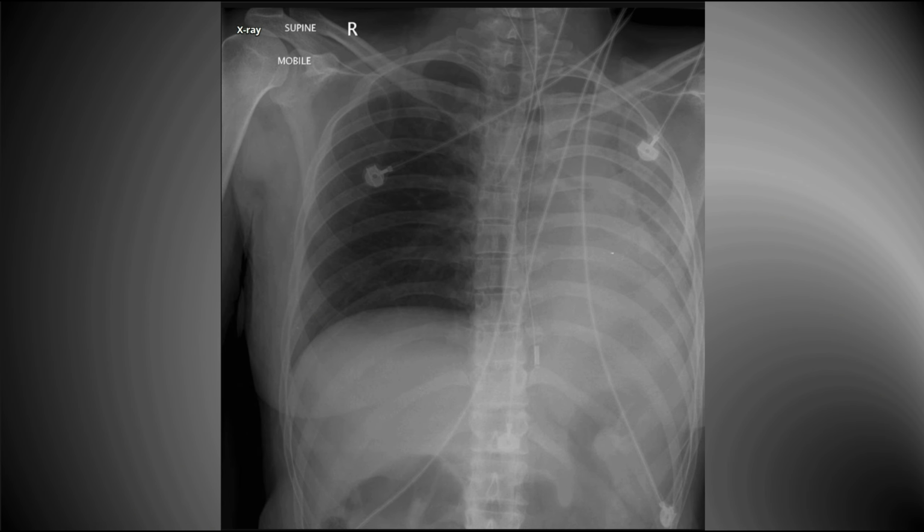A few more pictures that you should be aware of are these. What do you think is going on here? Well, in this picture, you can't see any of the left lung. It's completely collapsed. There is complete atelectasis, and there is hyperlucency of the right lung. There is a diagnosis to be made on this chest X-ray. Have a good look at it, and I'll return to this in a subsequent tutorial.